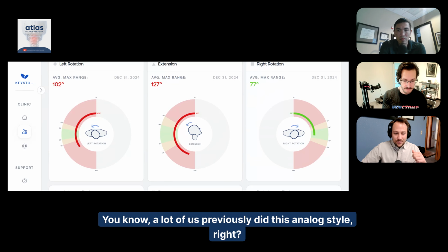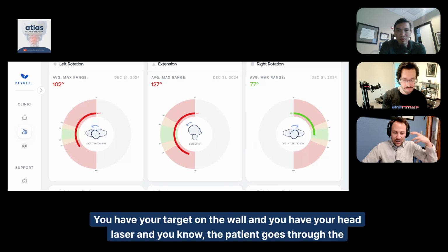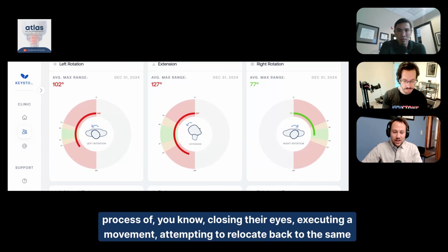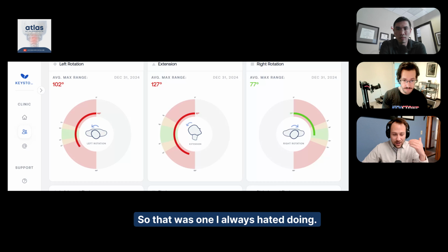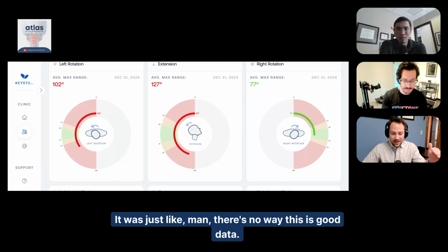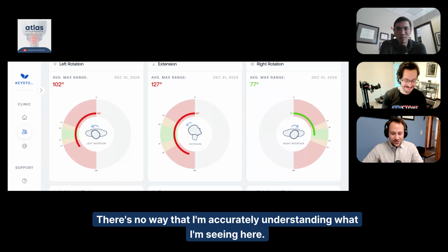A lot of us previously did this analog style, right? You have your target on the wall and you have your head laser, and the patient goes through the process of closing their eyes, executing a movement, attempting to relocate back to the same or relatively same starting position, and then we do a series of assessments on that. So that was one I always hated doing. It was just like, man, there's no way this is good data. There's no way that I'm accurately understanding what I'm seeing here.